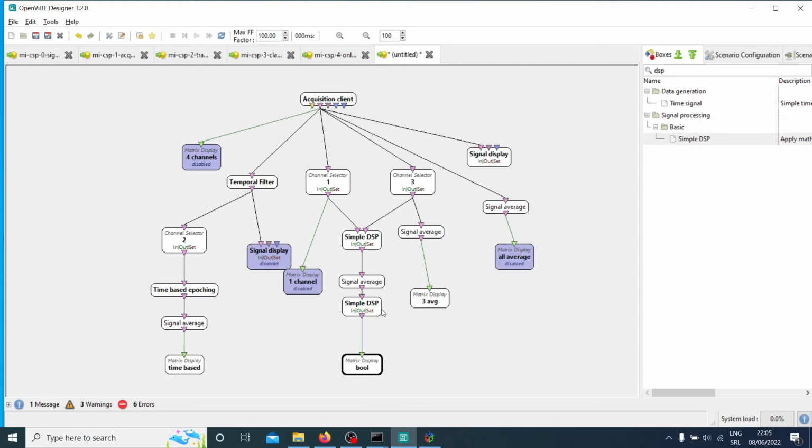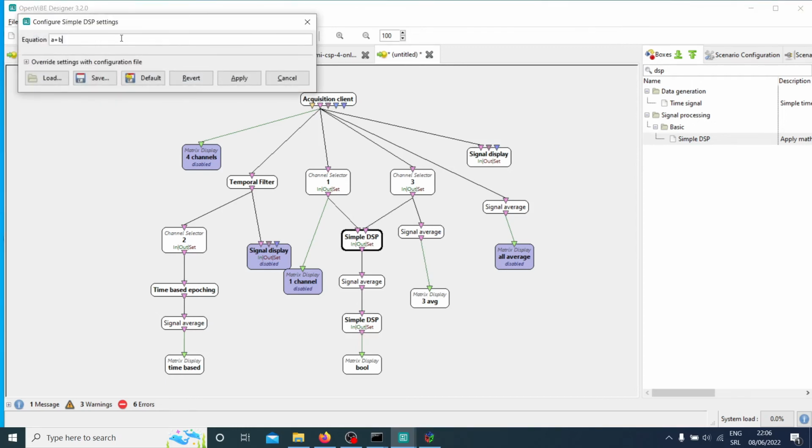This is actually what reminds me. If you want to do, for example in motor imagery, something like power band, like calculate the power of an alpha band, because in motor imagery you use power bands. You calculate the power of the band, alpha and beta. Well, alpha, technically it's mu. It's the same frequency range between 8 and 12, but it's called mu because it appears with this phenomenon during the motor imagination, and once you stop imagining the movement, there's something called beta rebound. So that's where you're using alpha, mu, and beta. Okay.